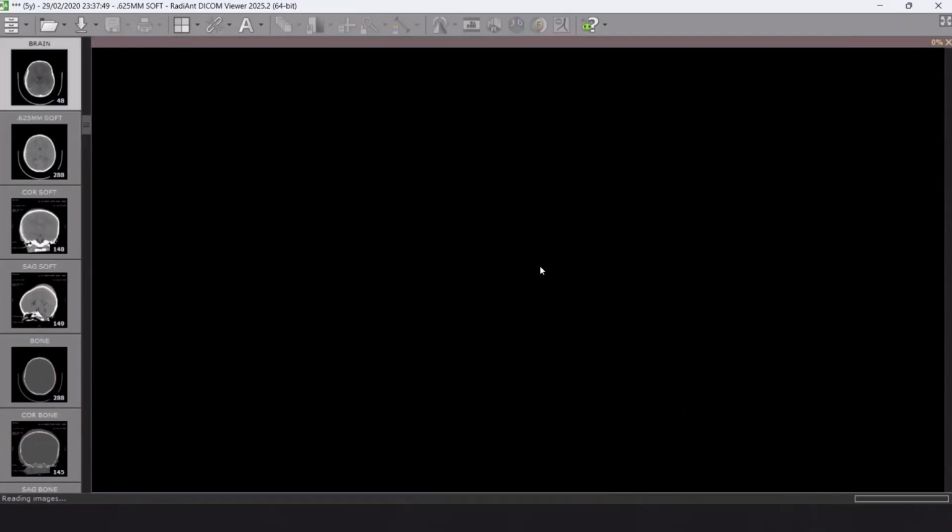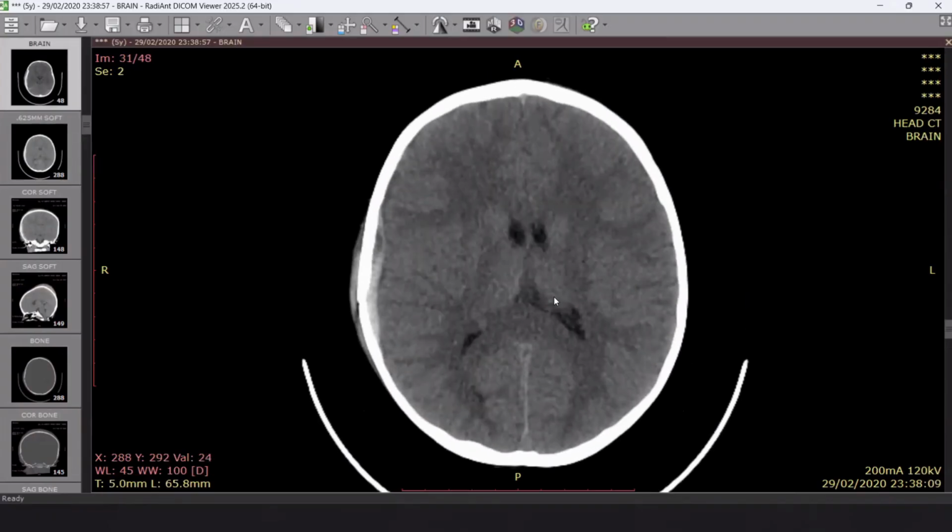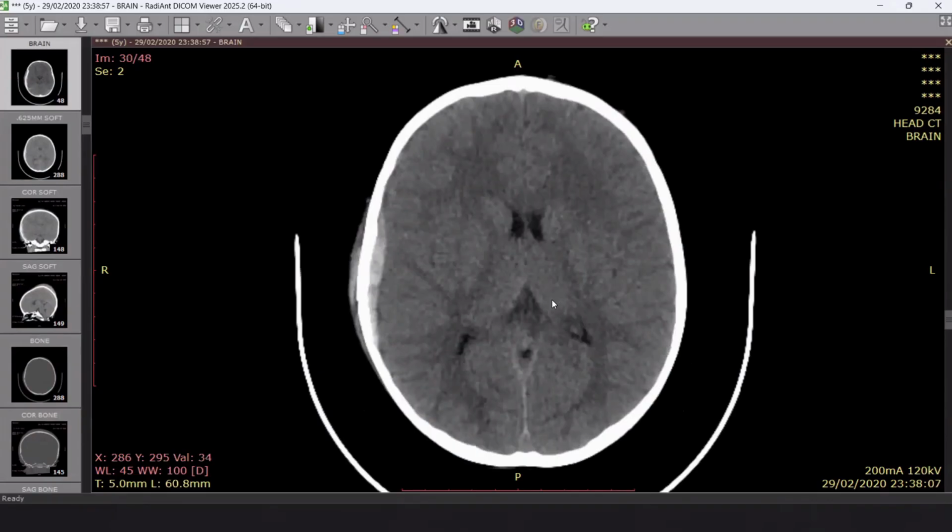Okay. So I would like also to add something here in the bone window. Do you have any more data that you want to highlight in any case of trauma? You described the hematoma very well, but you should also measure the thickness of the hematoma. Okay. This is about 5 millimeters in thickness. Okay. What else? Sir, in addition to that, I could appreciate that there is mild hyperdensity along the posterior fossa. It could represent trace subdural hemorrhage.